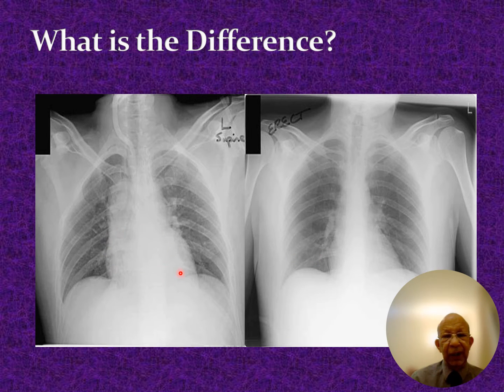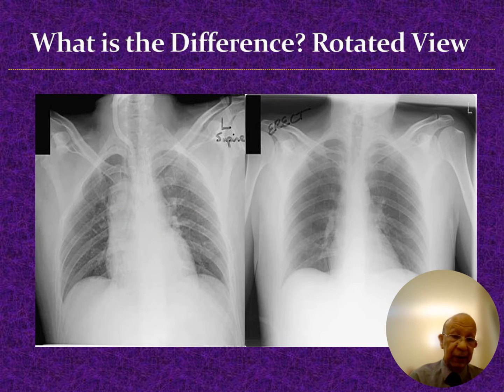Okay. Now again, in this patient, you would say, it's the same patient, right? In here, you probably say, oh, maybe the heart is a bit bigger than here, and maybe there is a shadow there. But actually, it's just a rotated view. You can see that the clavicles are not equidistant from the spinous processes in the middle there, right? And therefore, the rotation makes you likely to misinterpret. So be aware to look at the rotation, and at the blackness or whiteness depending on the penetration, because otherwise you have simply not paid attention to whether they are rotated or not rotated.